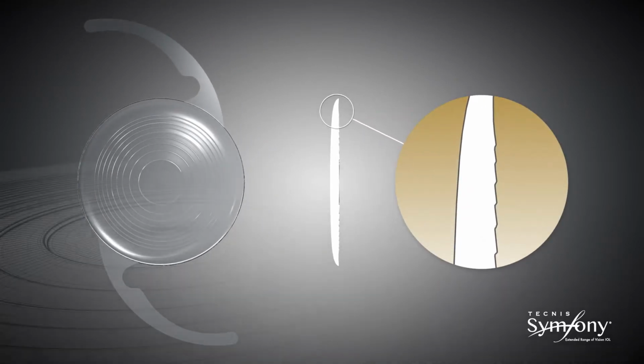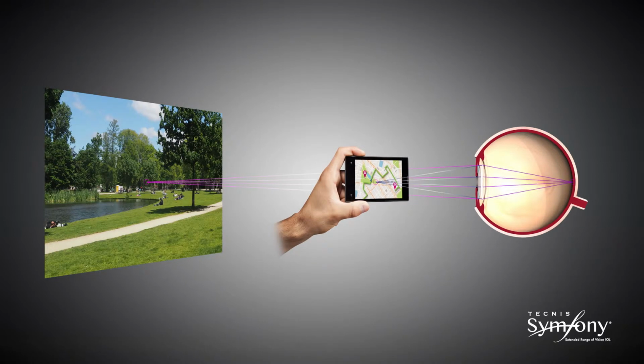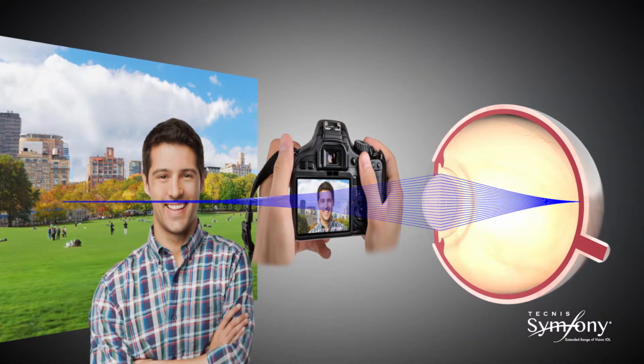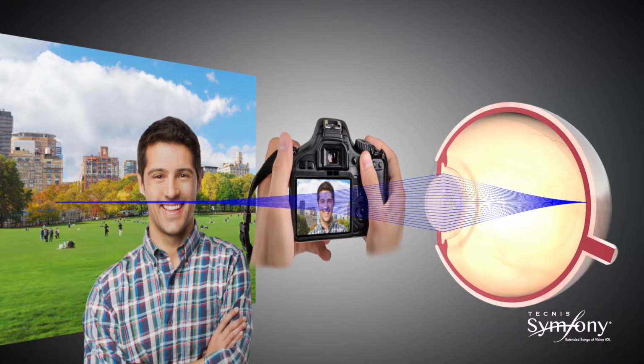As a matter of fact, light can be distributed in almost any desired way by modifying the echelette design of the diffractive lens. The echelette is the relief or profile of the lens, meaning its height and shape within each ring. The design of the echelette determines how the light is transmitted through the lens. In multifocal IOLs, diffractive technology transmits the light in such a way that it converges at more than one focal point. Tecnis Symfony diffractive lens technology is optimized to transmit light over a range of distances. This is called constructive interference and results in an elongated focus.